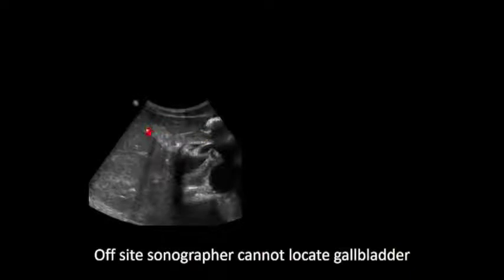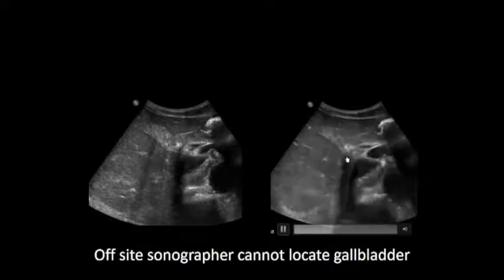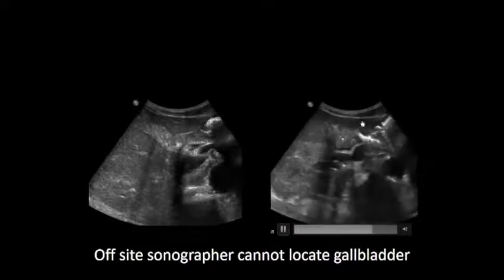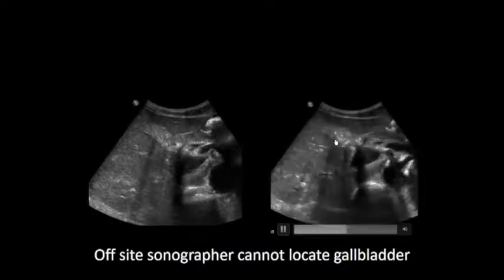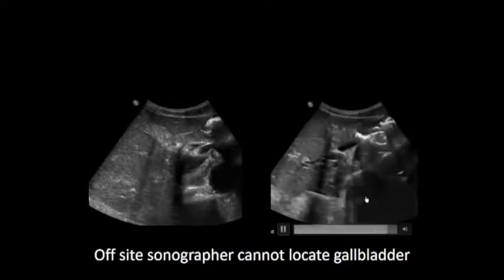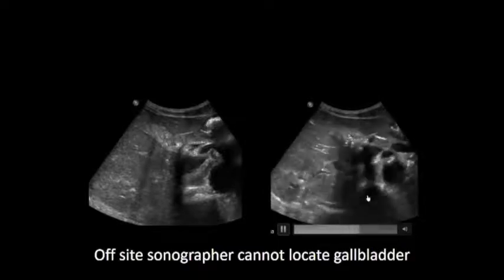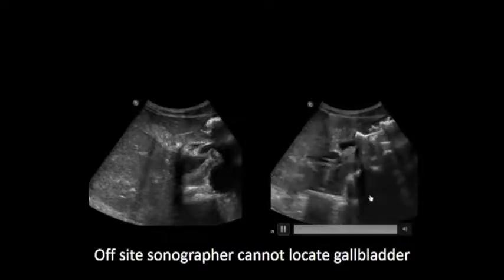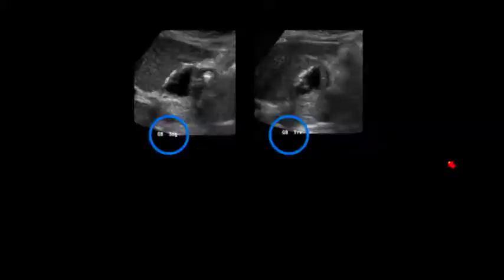Well, this was a little bit suspicious there, and again, it was the cine clip that saved us, because if you look, you can better appreciate that there's a gallbladder in there. It's so filled with thick echogenic sludge that it's even hard to see the stones that are shadowing, but that's what it was. So sometimes the sludge can be so thick, so bright, that it just becomes the same density as the liver, and it's hard to see.